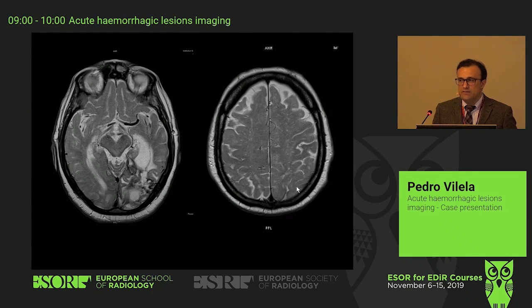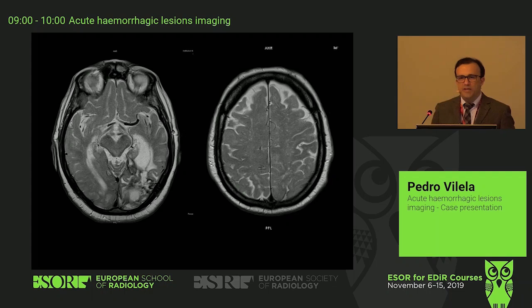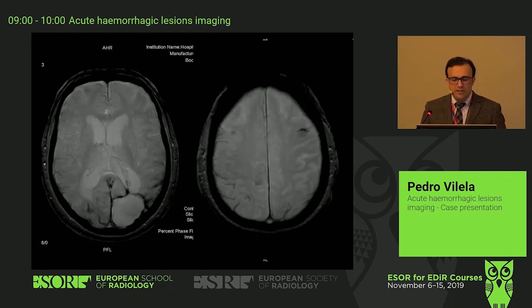Yeah. Very good. So hemosiderin. So signs of previous bleedings at the subarachnoid space that would help us to make the differential diagnosis and actually to point it out on the T2 star, and if you have done SWI would be even more extensive than to actually to put the diagnosis of amyloid angiopathy. Right? Good.